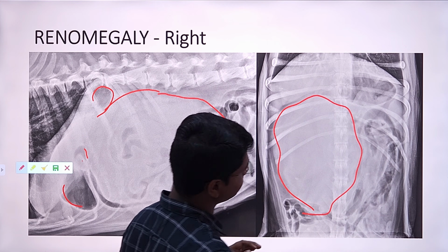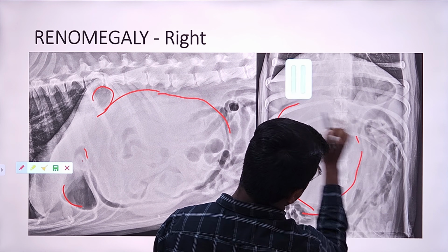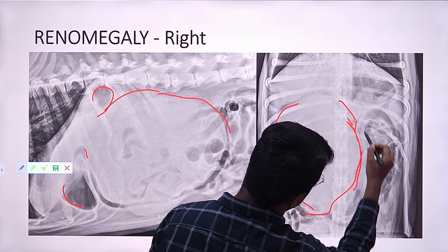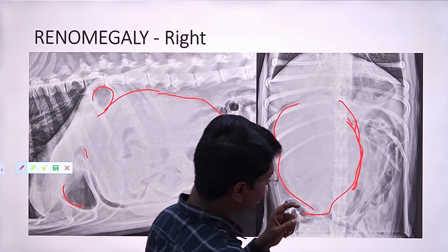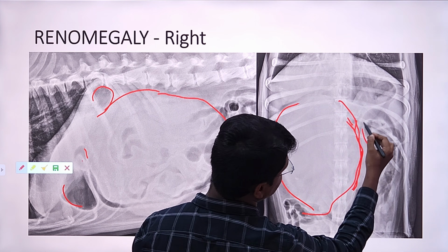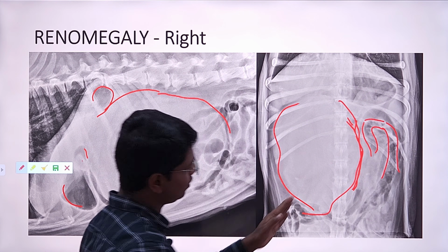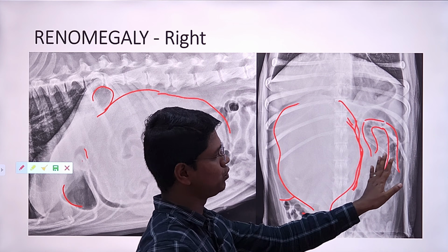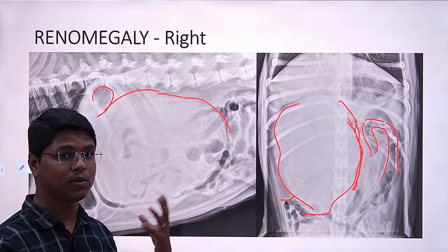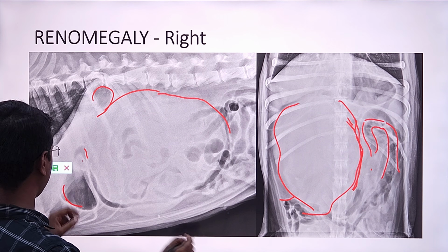Here you see the duodenum is on the left side. Here is the duodenum. Can you see this duodenum? A very thin structure, the duodenum. And another thing, the colon. Here should be the descending, transverse and ascending colon. You see, this is the ascending colon, transverse colon and the descending colon. The ascending colon, which should be on the right side, has been pushed to the left side. By looking at all this, you have to diagnose the disease. Now let us go to other pathologies.